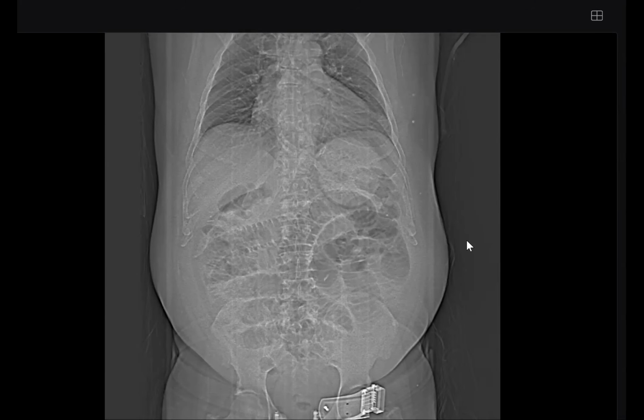Sir, I have been provided with a scanogram image of an adult patient for which the CT has been done. On this scanogram, I can appreciate multiple dilated small bowel loops identified within the center of the abdomen, which are concerning for intestinal obstruction. I cannot appreciate any air within the distal bowel loops, and I cannot appreciate any air lucency projected over the liver shadow in this scanogram. I do not appreciate any free air under the diaphragmatic contours.